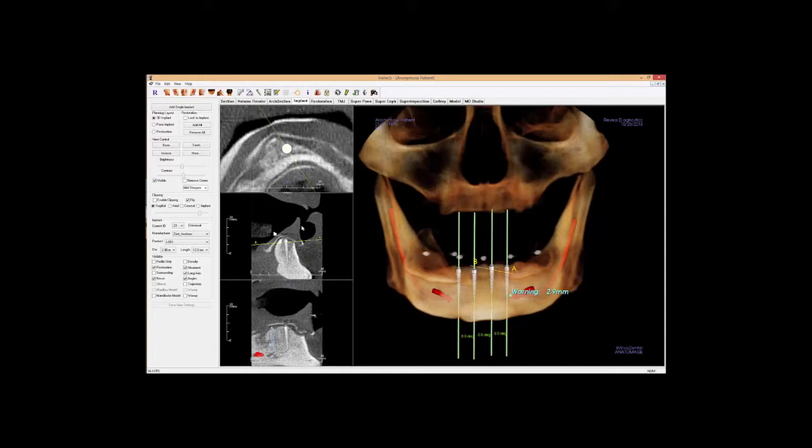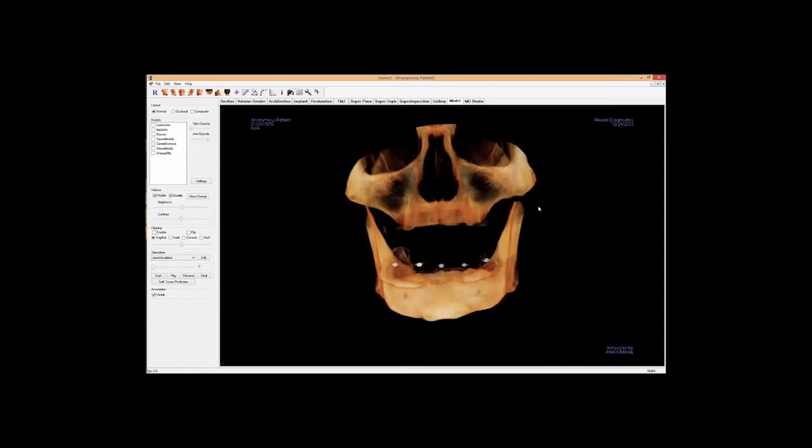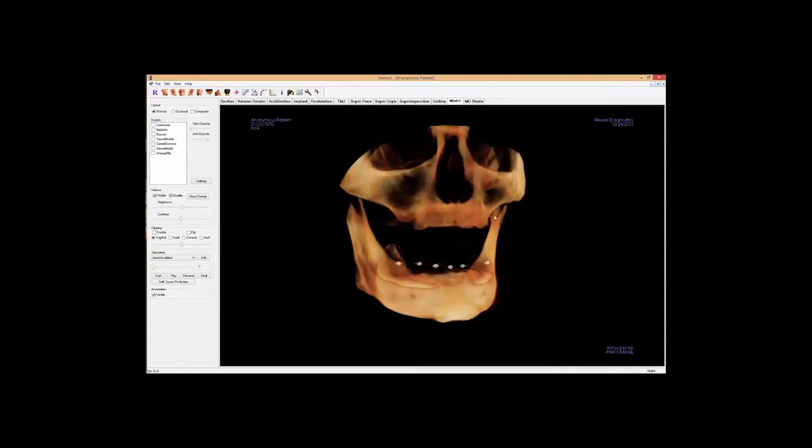We'll be working up this case with Anatomage, a surgical guide company out of the Silicon Valley in California, and they have some additional tools to enhance the visualization and accuracy even further. So once Anatomage has finished merging those files, they will send it back to us through the website in one single planning file. So again, we will have our CT scan, and you can see that here.